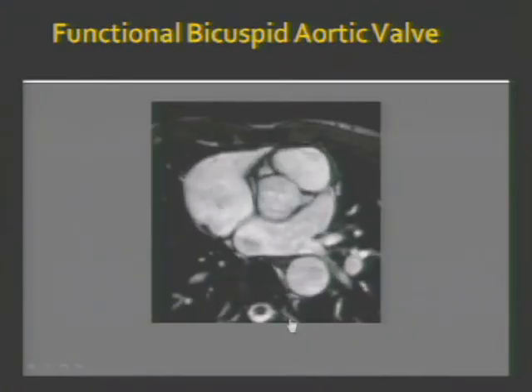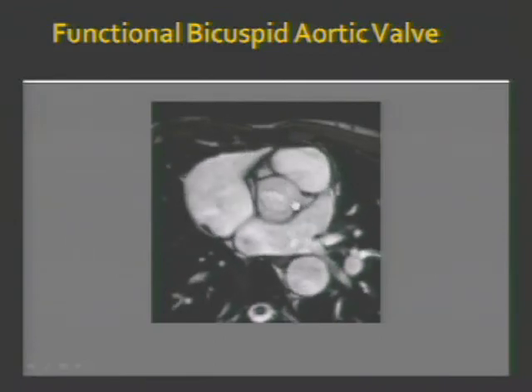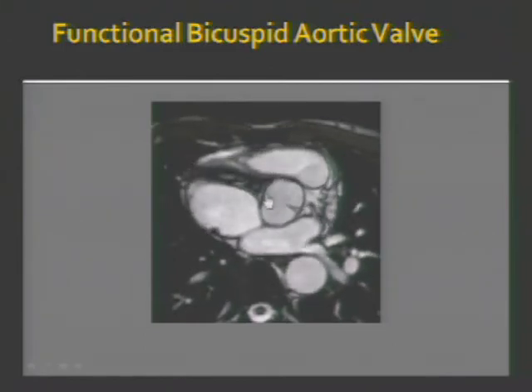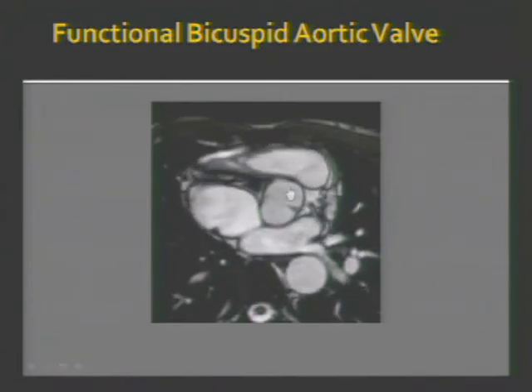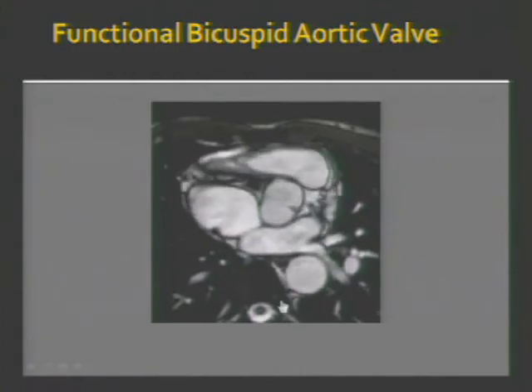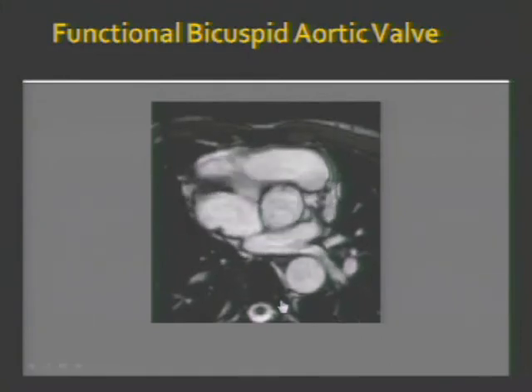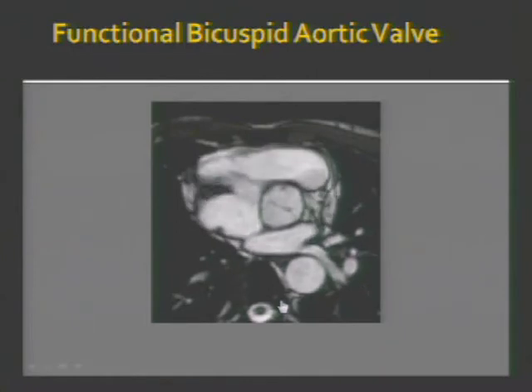The bicuspid valve comes in two flavors, and this is the second flavor. So here is what is called a functional bicuspid valve. In contrast to the first one, you will notice that this patient actually has 3 sinuses. So this is 1, 2, and 3. But what's really happened is that this commissure is fused. So between the two adjacent leaflets, the commissure is fused with a raphe, and now it opens and functions just like a bicuspid valve. So it's termed a functional bicuspid aortic valve.